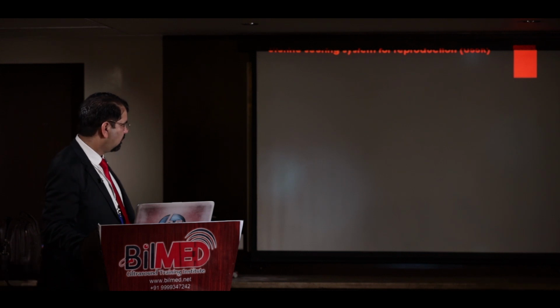What is this? Now see, the endometrial thickness, like in the biophysical score of the fetus, I am taking some points, then I am adding on to these points, then I am giving a score. Same here. How? Endometrial thickness. Now see, if the endometrial thickness is less than 7, straightaway 0, and if the endometrium is between 7 to 9, the point will be 2, and if it is 10 to 14, it is 3.